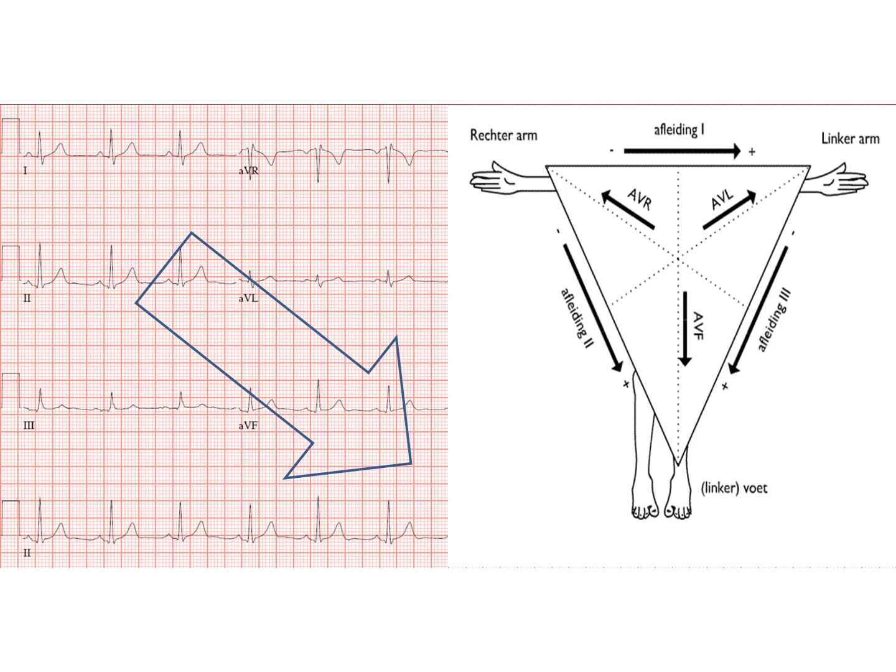Now, lead 3 is a little bit trickier, because lead 3 looks down and to the right. And in this particular case, electricity is going down and left. So it's going to like the fact that electricity is going down. We're going to have some positive deflections, but we're also going to have some negative deflections because the electricity is going leftwards, and this lead looks down and right.